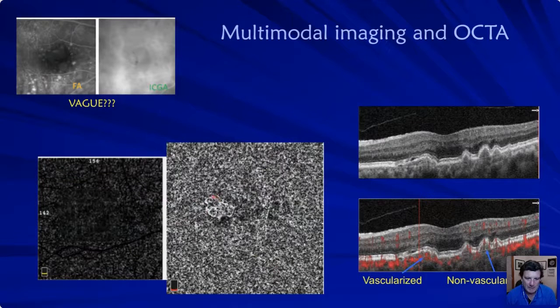And look what we could see developing down in this area. There's a choroidal neovascular membrane. Not going to be seen on a fluorescein. It's down below, and it's not leaking. Maybe it is a little bit. Maybe that's fluid right there. So you could call it an occult non-exudative. If you think that's fluid from it, okay, it's an occult exudative. But it's not going to be seen on a fluorescein angiography.